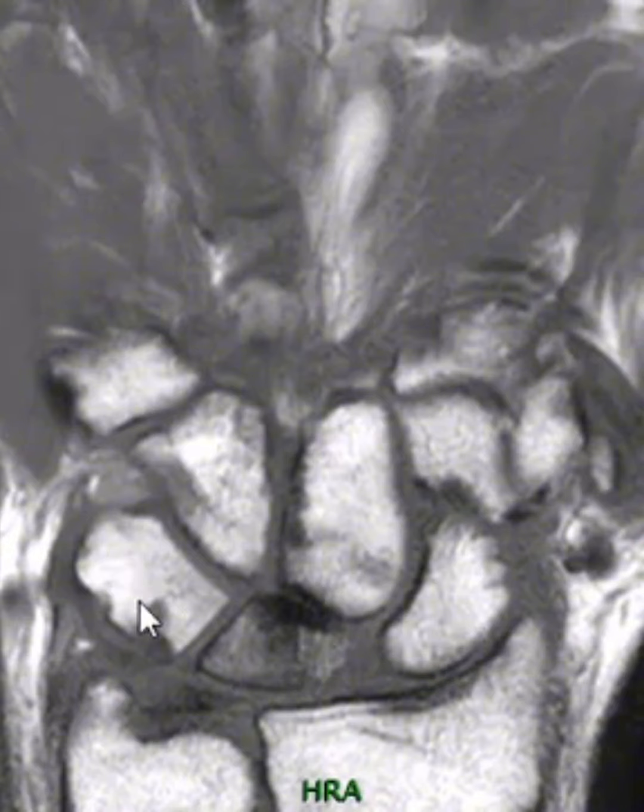So this is the scaphoid, lunate, triquetrum, and the distal radius. A lot of the time we see lunatomalacia associated with ulnar negative variance, and that is when the ulna is short relative to the radius. There's a little gap where the TFCC fits in horizontally, and the ulna is too short, and that will cause abnormal pressure between the radius and the lunate bone and lead to lunatomalacia or Kienbock disease.